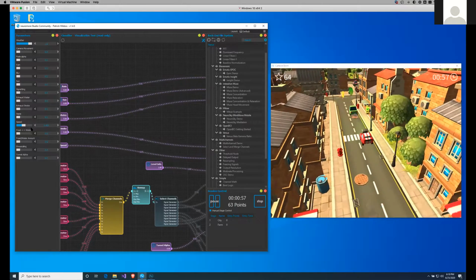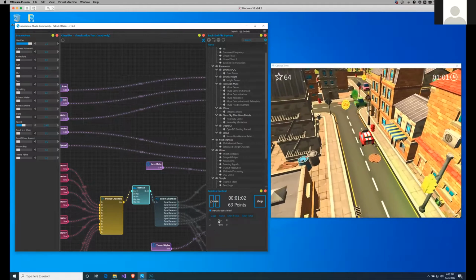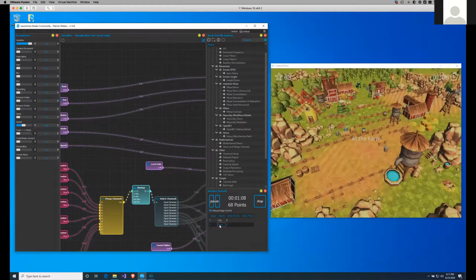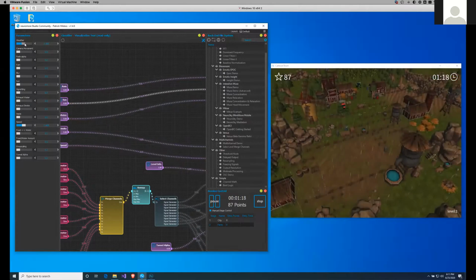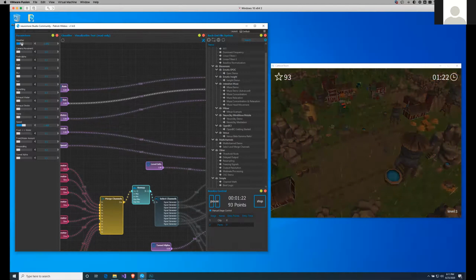And another feature that the visualizations have is the stages that I mentioned. So currently we're in the city, and down here in session control, I could also switch to the farm. Now we're at a farm, and on the farm, we can control the weather. You can make it a little bit more sunny. You can make it a little bit more rainy, like here. The rain is also attached to the speed of the windmill.